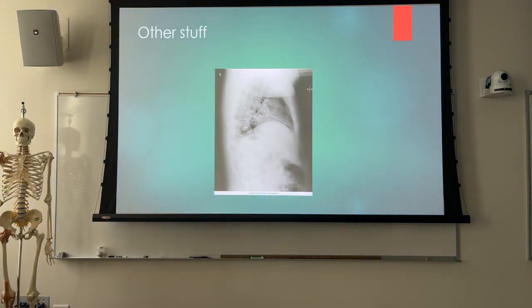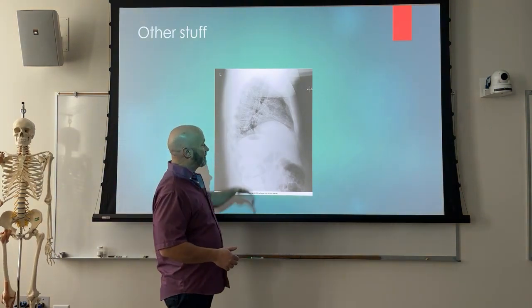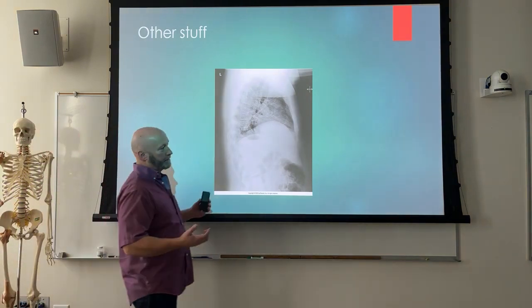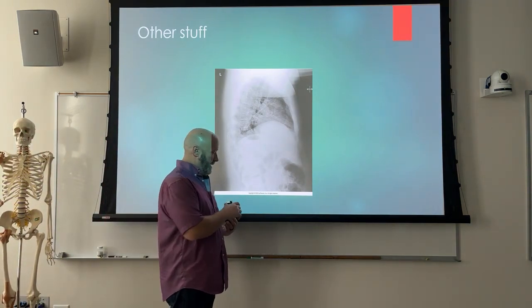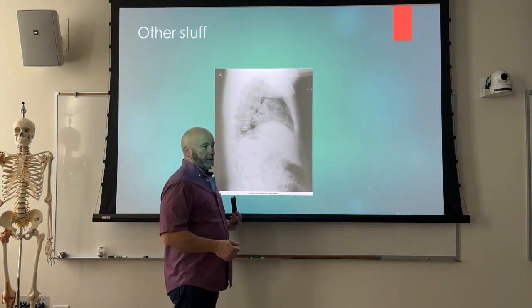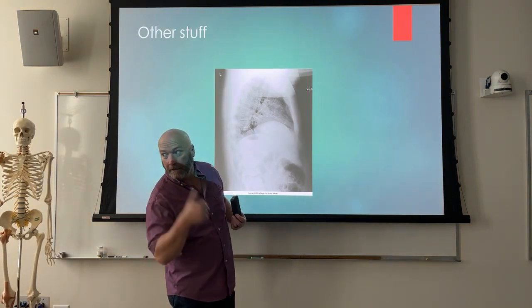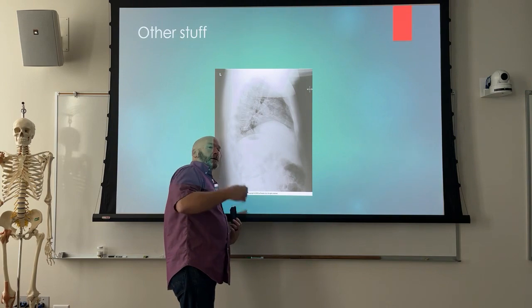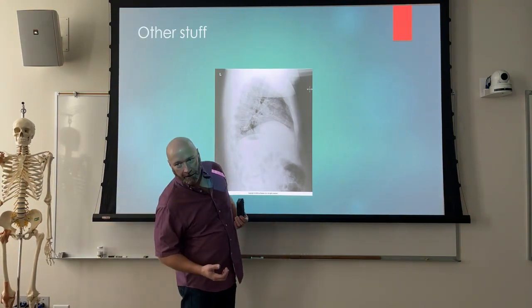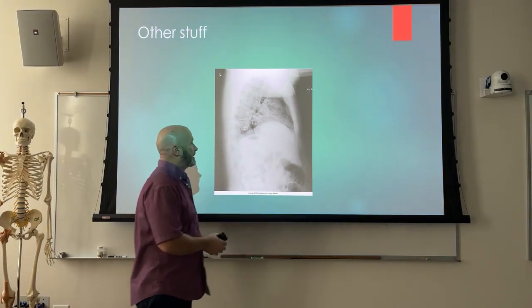All right, so in this case, we've got a couple of different things going on. We've got separation, vertical separation of the diaphragm. So back to our example, I can't really do this with that guy without possibly throwing him on the ground. But you've got vertical separation of the diaphragms, right? So where does the gastric bubble go if I'm leaning away from the image receptor? It goes up. If I'm leaning towards the image receptor, it goes exactly opposite. So if you've got a patient with broad shoulders and narrow hips, then it's probably going to go up. If you've got a patient with broad hips and narrow shoulders, it's probably going to go down.